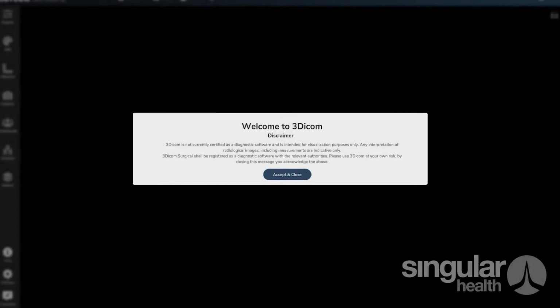Hello, this is Tom from Singular Health, giving an introduction to a 3Dicom virtual surgical planning platform and integrations. We'll start with the 3Dicom integration for virtual surgical planning.